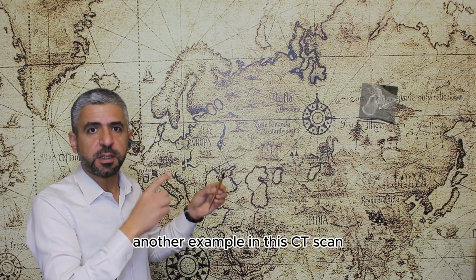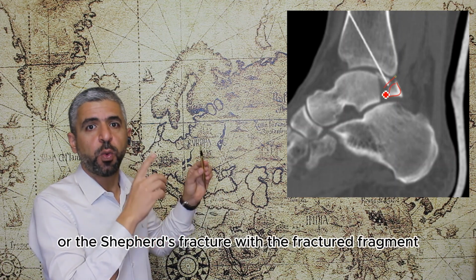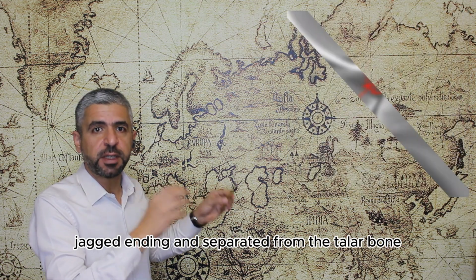Another example, in this CT scan, we can see the posterior talar fracture or the Shepherd's fracture with the fractured fragment jagged ending and separated from the talar bone.